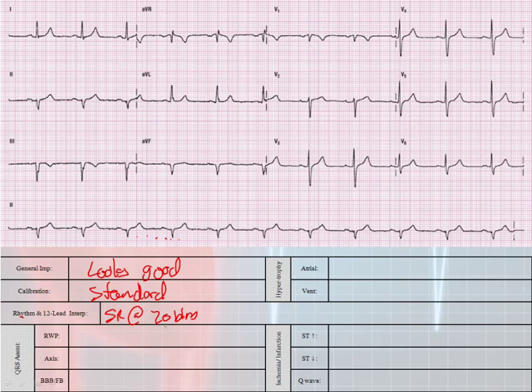My 7s keep coming out like 2s. It's not supposed to do that. Next, we're going to look at our R wave progression. Well, if you look up here in the precordial leads, you have negative, negative, and then it transitions. It's trying to transition to positive here, and then it looks kind of positive. So I'm going to go ahead and say that this is a good R wave progression. Your axis, I'm going to look up here in lead 1 and aVF.